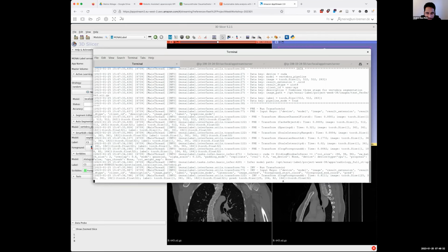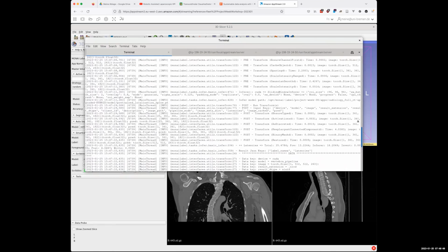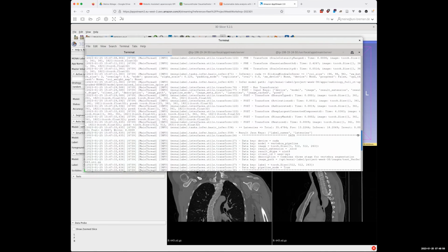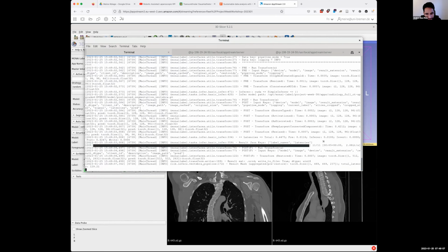So I think it's running already the last stage. You can scroll up and see the different stages. So those are the logs. And the first time you are running the inferencing, it's gonna be a little bit slower because of the time taken to cache the model, right, Andres? Yes. Usually the second time you perform inference, the second volume, it takes 20 seconds less than the first. So it takes apparently 11 vertebrae.